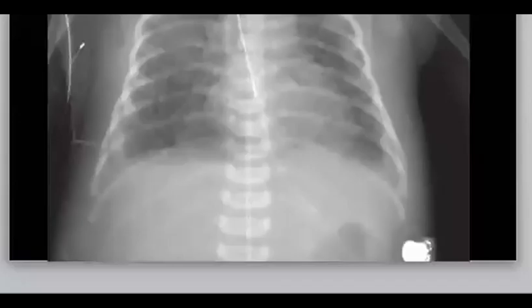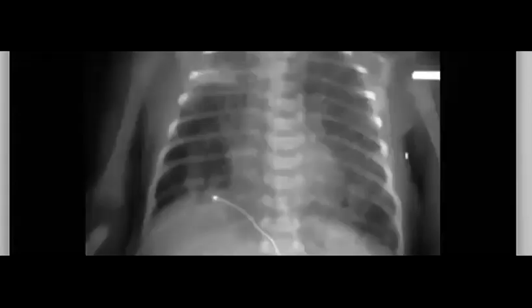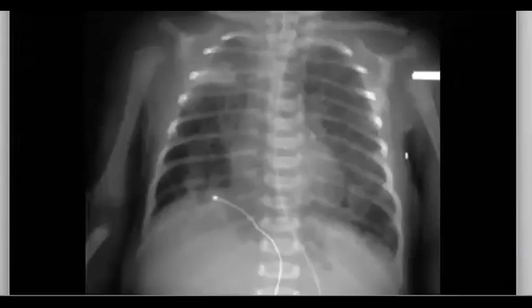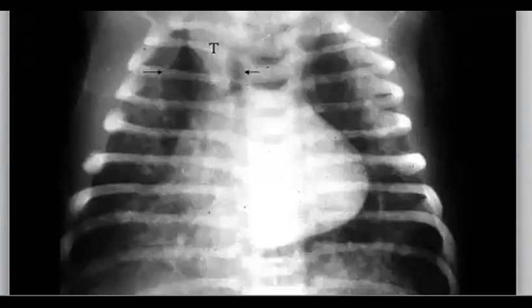If you now become familiarized with this, again, what is this one? How do you describe it? The opacity is very high. So now you will think about either meconium aspiration or pneumonia, perfect Abbas. Which type of pneumonia? The non-group B type. And what happened here? TTN and meconium aspiration.